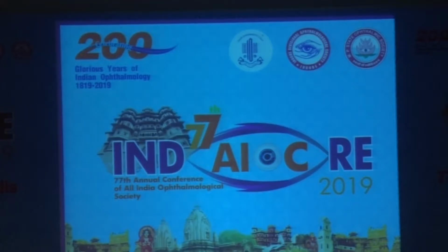Just one point. In which group of conditions do you think that infrared reflectance would really make a difference in diagnosis? The dry form of age-related macular degeneration is one area. To pick up the drusen, studies have shown that the reproducibility is much better with infrared reflectance imaging rather than conventional photography. So that is one area I would say.